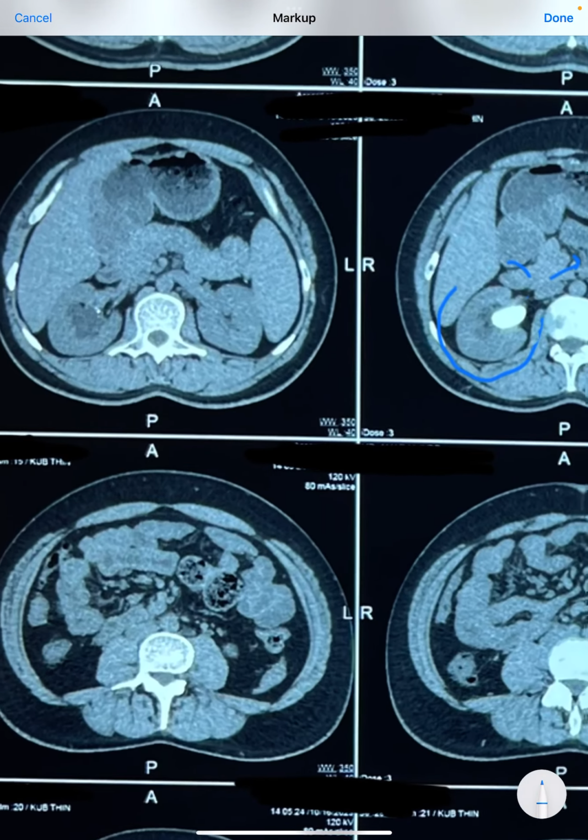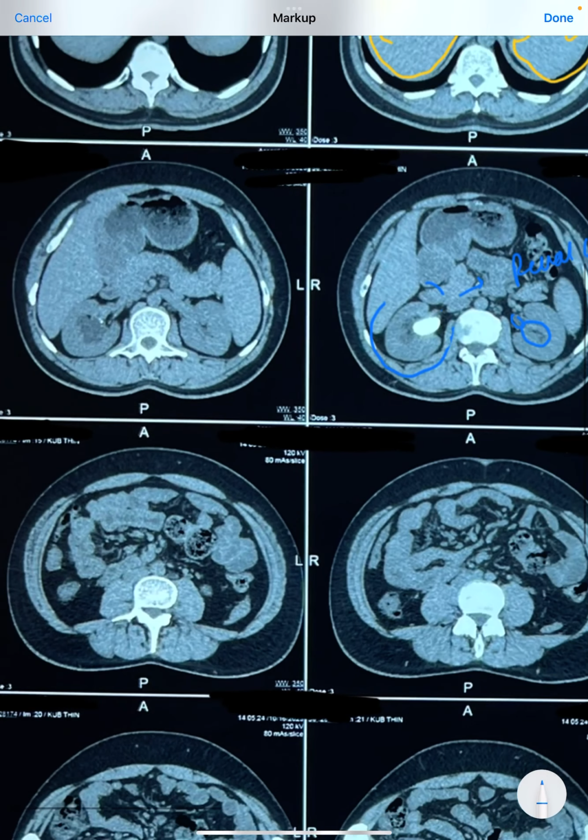So how you can see that it is causing blockage is just compare the left kidney and the right kidney. See, I have already told this is stomach, this is air of the stomach, and this is the fluid in the stomach. Just see the radio opacity of this. This is kind of blackish structure.